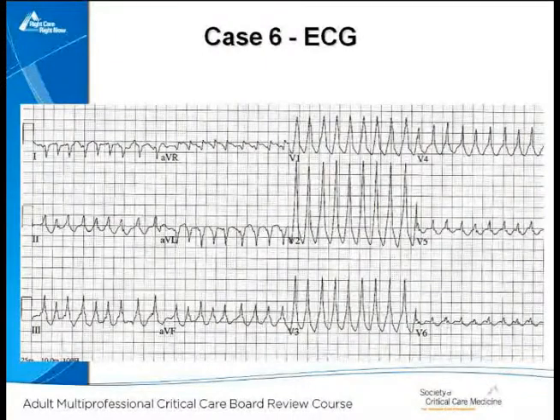We're going to make 40%, right, for one of these? Okay, so the right answer is procainamide. So what's the rhythm? 17-year-old tennis player, wide complex but irregular tachycardia. Notice that it's not perfectly regular, and there's changes in the QRS morphology.